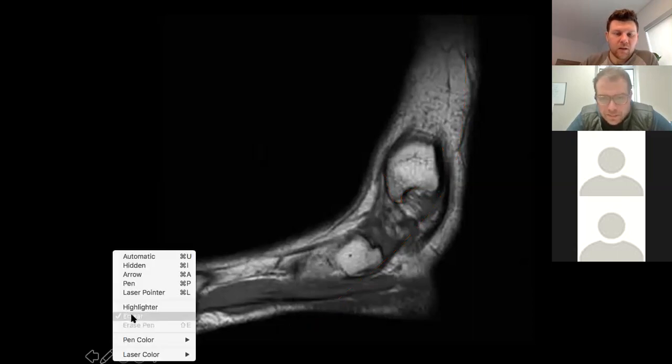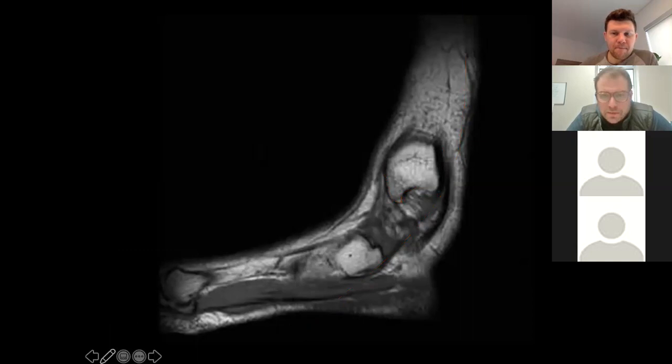And you can see here, even better than the x-ray, how the anterior portion lies more distal or lower than the posterior colliculus. Which again is important in trying to identify which portion is affected, whether it's anterior or posterior.